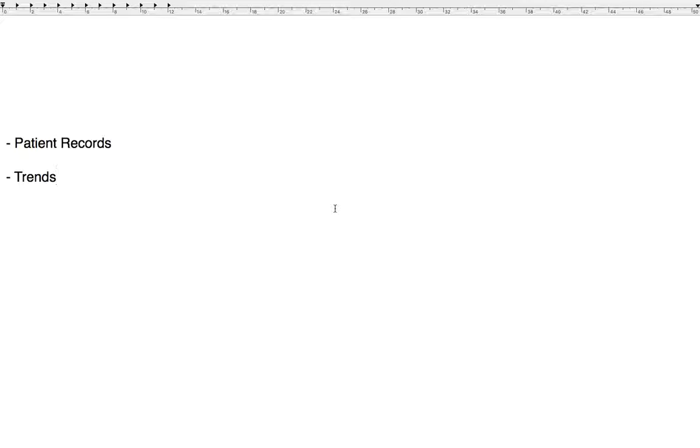In this video, we will see the trends, which means the patient data in a graphical manner, and the patient records, how the attached patient records look for the patient. So let's see the trends first.